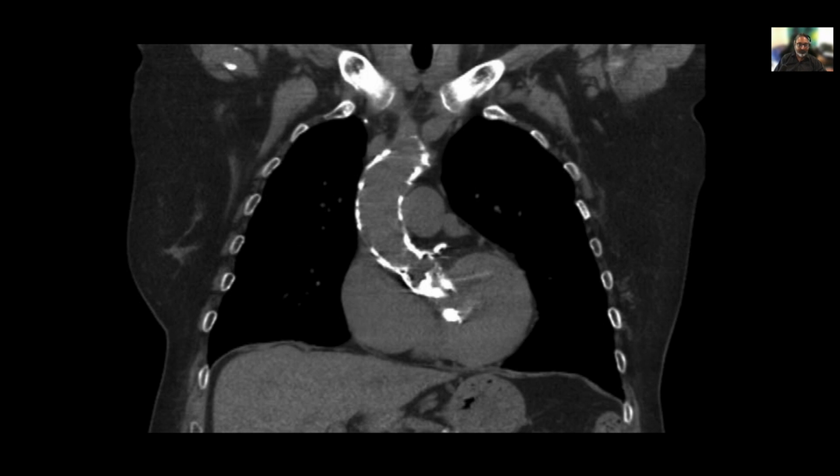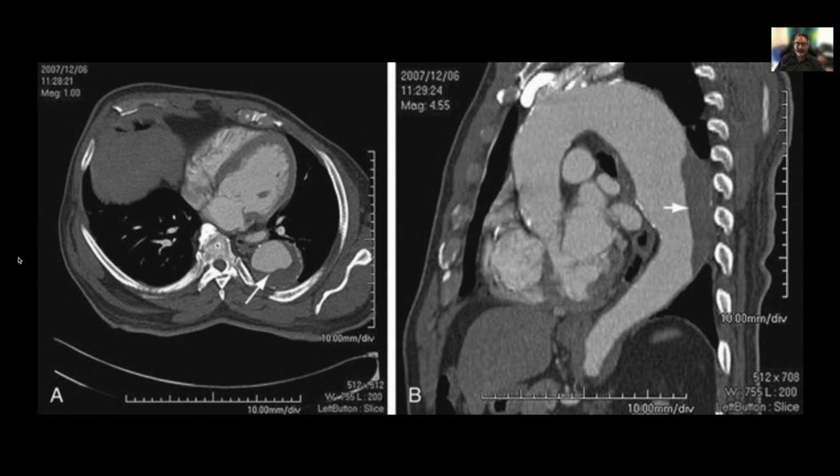All right, let's do this one. And the pathology is here and here. Okay, so that would be the location of the descending aorta. Correct? Makes sense there, just on the right-hand side picture. Yes. And yeah, it looks like there's a false lumen. Yes. Would that be right? Yes. Like an aortic dissection. Yeah, that is an aortic dissection. There you go. So that's definitely an aortic dissection and maybe even an aneurysm, but definitely a dissection.